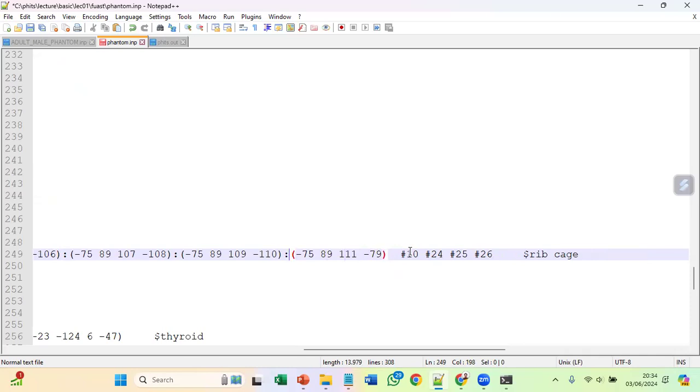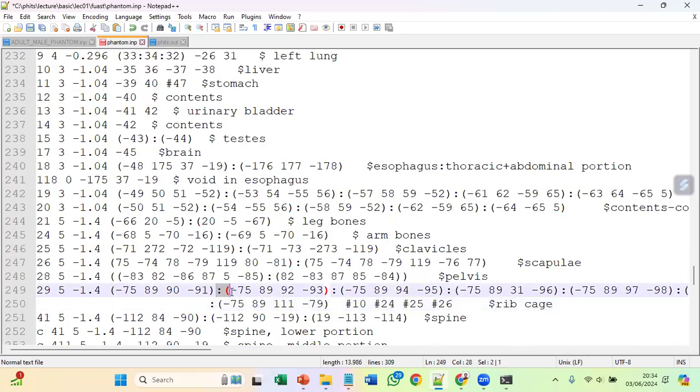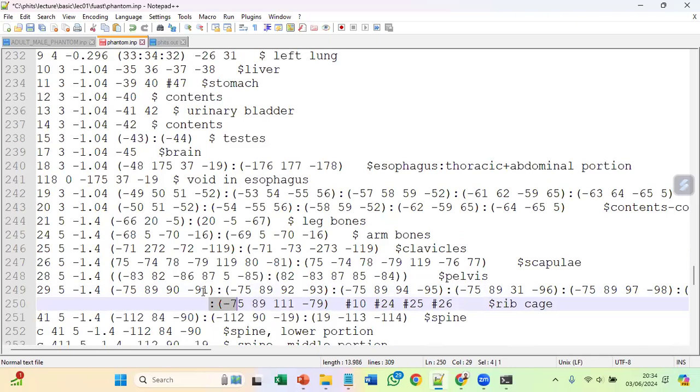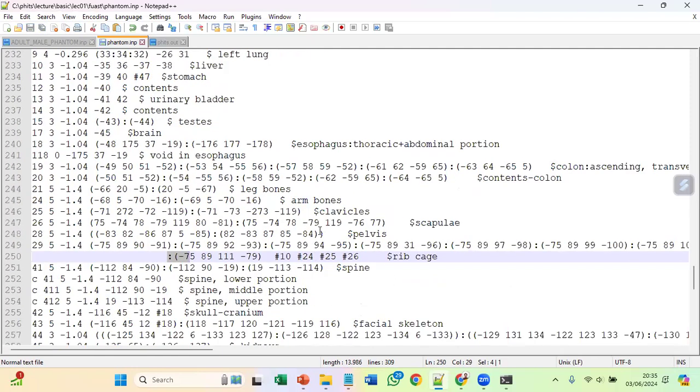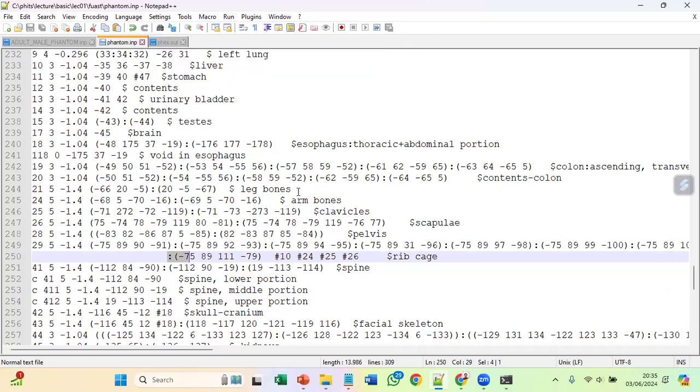And the last one, we must enter in this section and put some tabs until the upper row and the lower row look like this. How do I know? I don't really know. I once ran this code and tried to copy it to PHITS, and I just found this method and it just worked. So yeah, we're going to run this again.